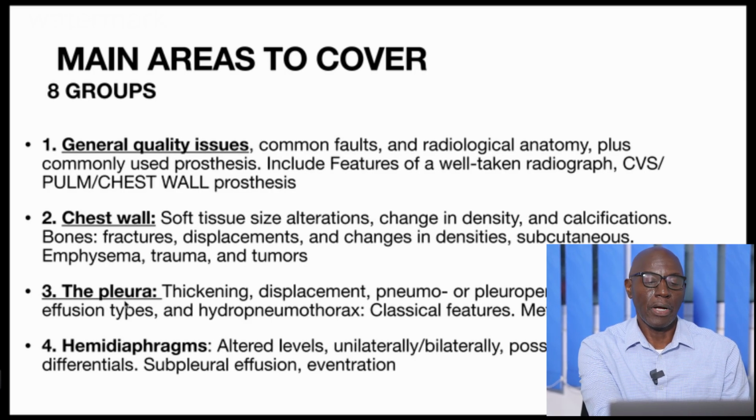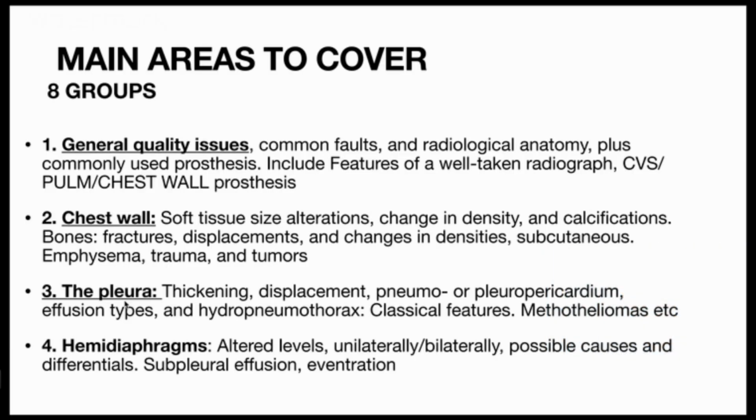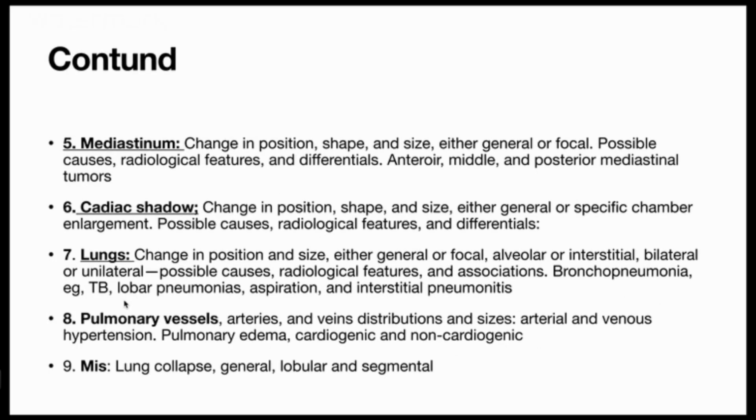Here, the pleura, again, we look at whether it is thickened, displacement, fusion, and all these things. In the hemidiaphragms, one is interested in the levels of raising, whether either one is higher than the other. The other aspects, like I said, we go from the mediastinum, we go from the hemidiaphragm, we go to the mediastinum. Of course, this also includes the cardiac shadow.